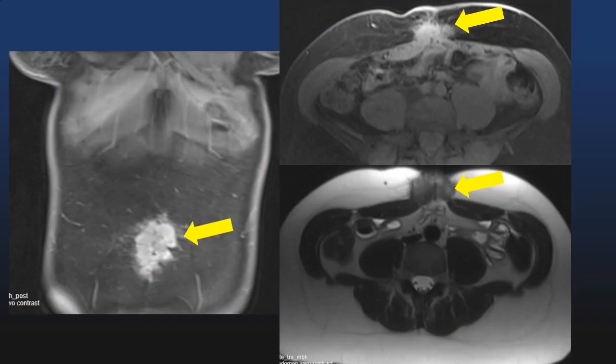Here's another patient with a solid appearing abdominal wall mass, in this case near the umbilicus. This patient had a painful mass and has a history of prior laparoscopy at this site. On MRI, it appears heterogeneous on both T1 and T2 weighted images and is relatively T2 dark. At surgical excision, this was found to be a focus of endometriosis in a patient with prior diagnostic laparoscopy.